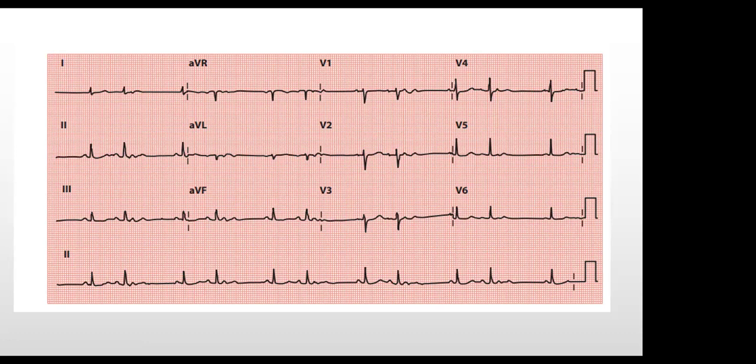I would think so too, because if you look at this PR interval, this is definitely not the same as this.